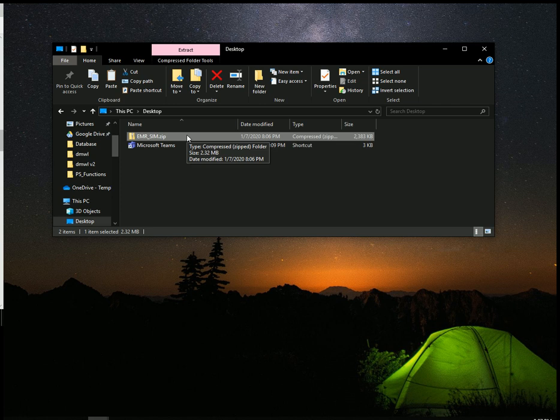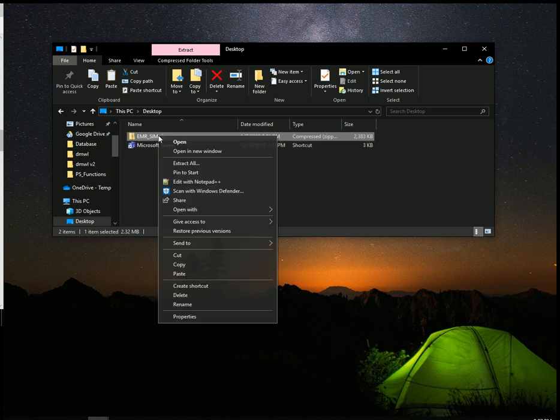And then if you want, you can also create actual orders for procedure if you want, and test your Modality Worklist server with a little utility. So I'll just show you what this looks like.